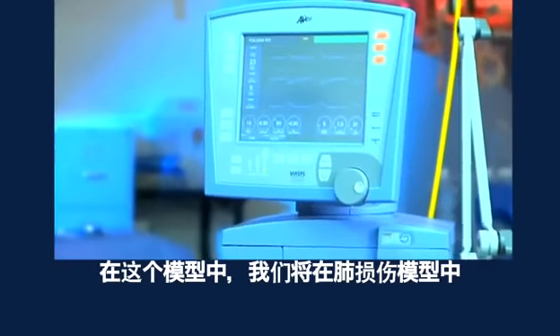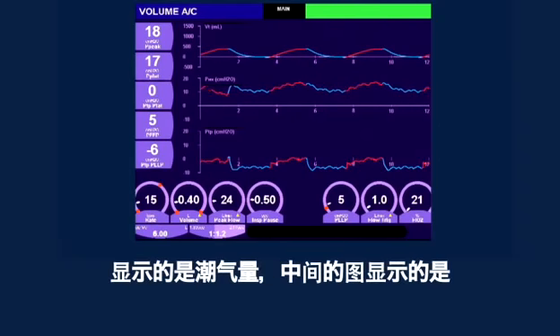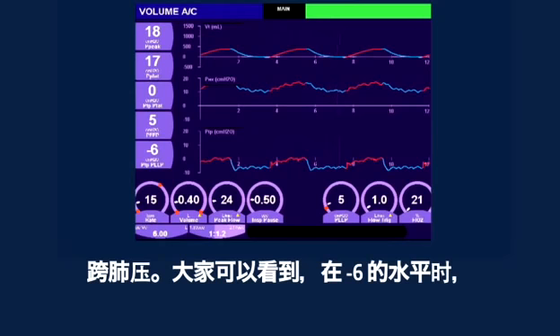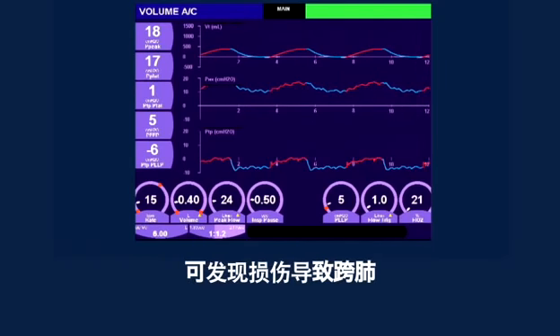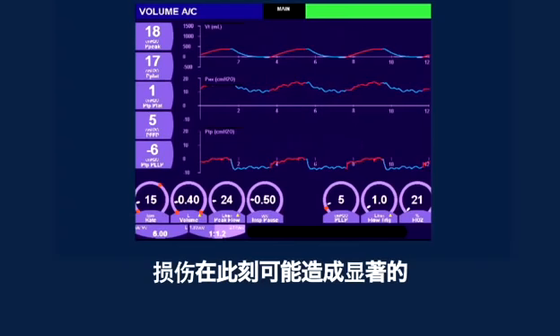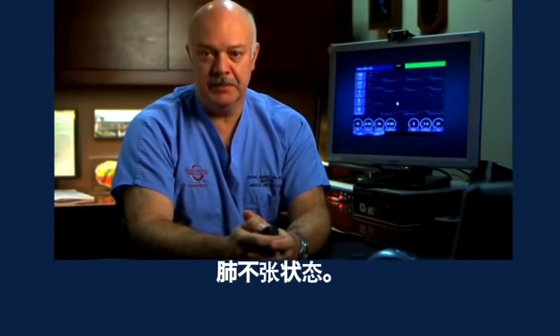In this model, we will show the different levels of transpulmonary pressure in a lung injury model. You will see in the upper graph the tidal volume, in the middle graph the esophageal pressure, and in the lower graph the transpulmonary pressure. You can see that the injury has produced a significant drop in the transpulmonary PEEP pressure, to a level of -6. This means that there may be some significant atelectasis caused at this point with this injury.